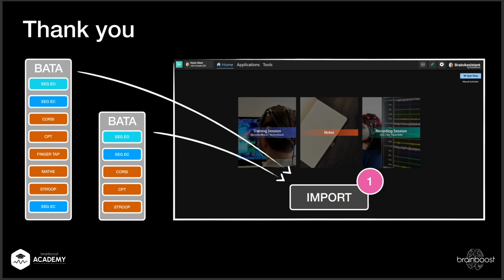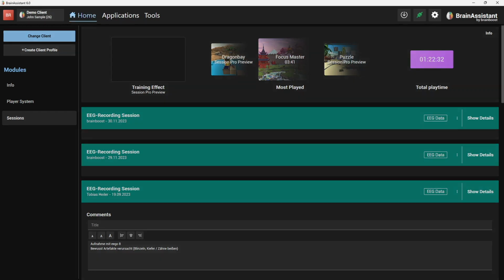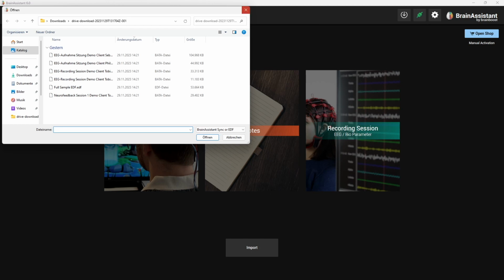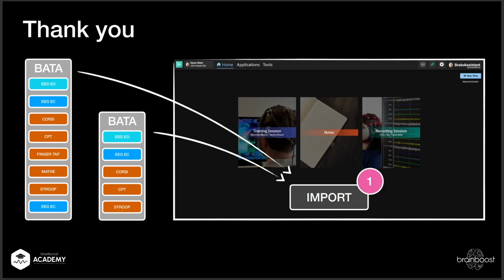How do you do that? After this webinar, I will send you .bata files. What does that mean? You know, any file is named xyz.pdf, .docx, .whatever. And the files that our Brain Assistant can handle are called .bata. This is our own format, so we invented it. And so I will just send you 2 files, and in the main menu here, you need to press this import button. It looks less spectacular in the main menu. Here, it is import. And when you press it, an Explorer opens up, and then you can select the file. And this is pretty cool.